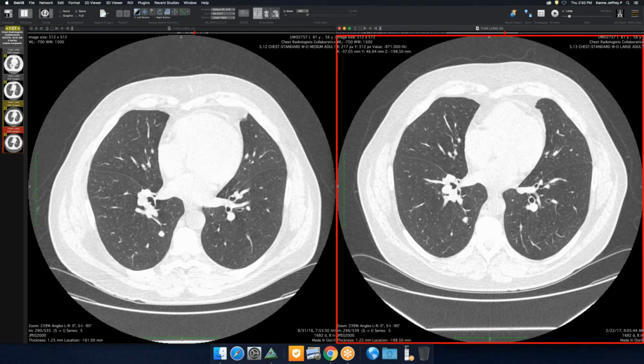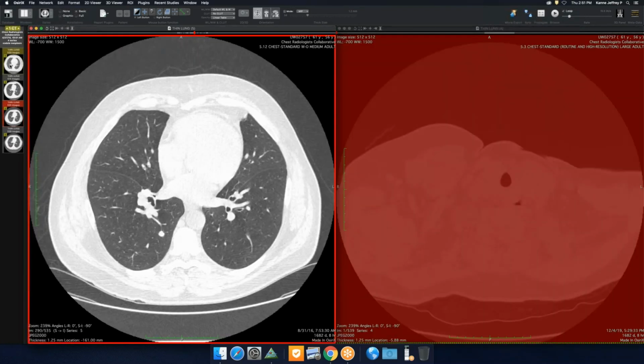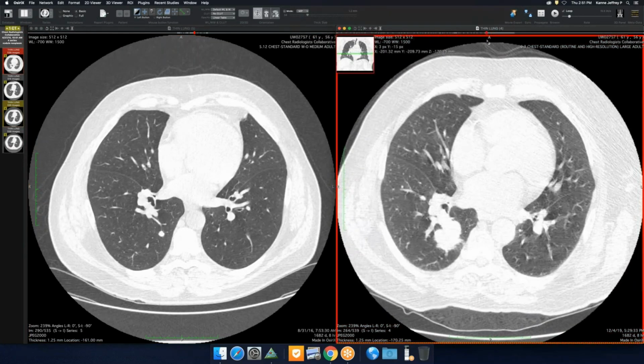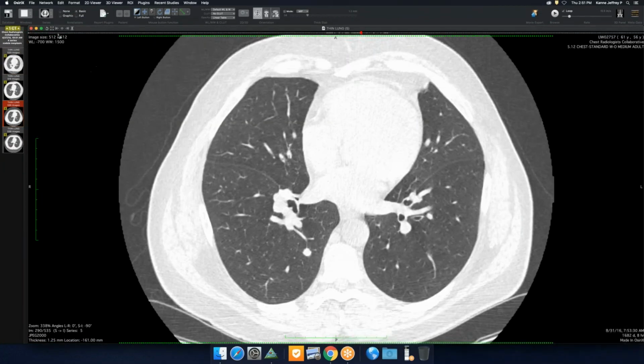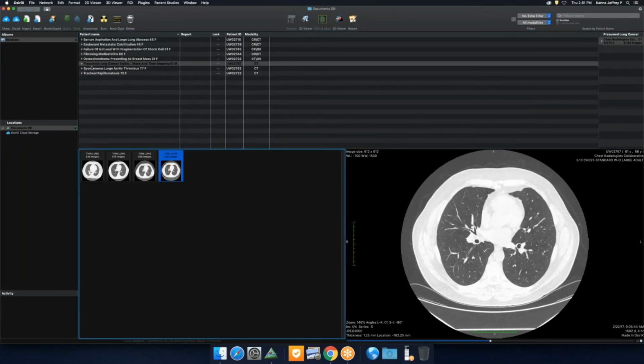Typically the 2-year rule is based on our data. But you're right, there's always a small chance that something else engulfed it, or it just decided to grow all of a sudden. You would think something this big... we're talking only 2 years between this scan and this scan. It went from stable for 2 years to all of a sudden taking off. So maybe something mutated and it just went off like wildfire. Yeah, probably. Those are scary ones for sure.